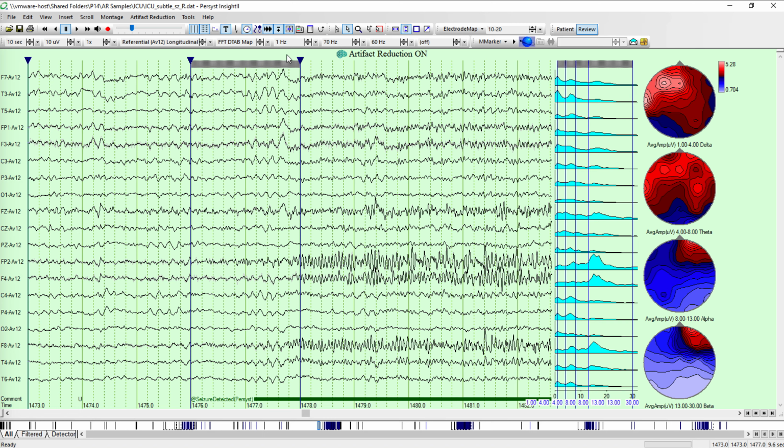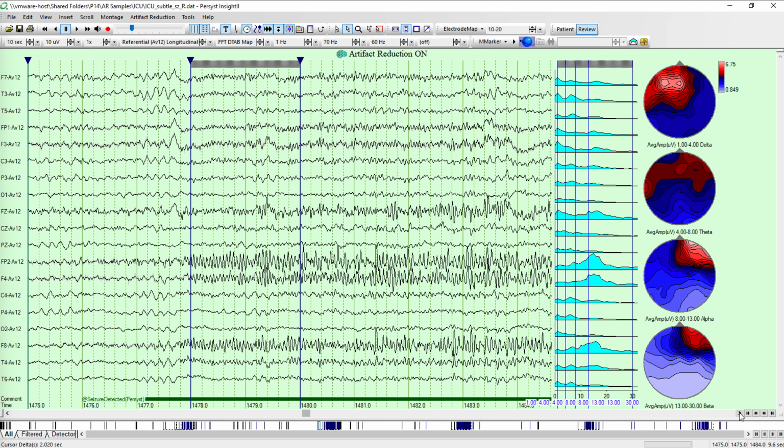But here, I've just created this range, and I can grab this gray bar at the top and move it around. But really, what I want to do is move the EEG underneath that. What that looks like is when I click this arrow, the range stays there and the EEG moves underneath it. And instead of clicking the gray area, if I just use these single thin arrows at the end of the scroll bar, it's going to move just 1 second at a time.